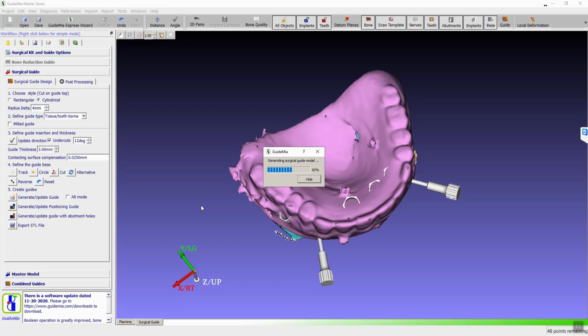So for this, ideally we need to go to the segmentation page and trim those bad areas so we have a good shape. But I'm kind of taking a chance here. We've been playing with the circle right, circle left, wax on, wax off. Well, circle things, right? I want to mention for post-processing of this kind of guide, never cut through this area. Just make a hole. You're Mr. Miyagi, Frank. Cut away.